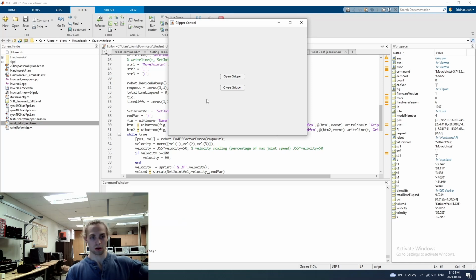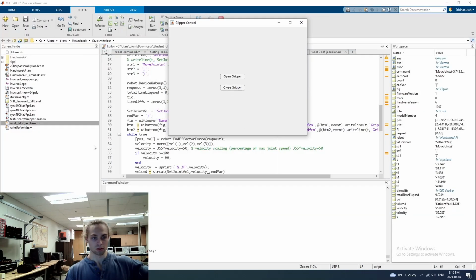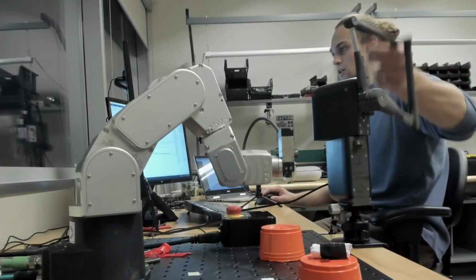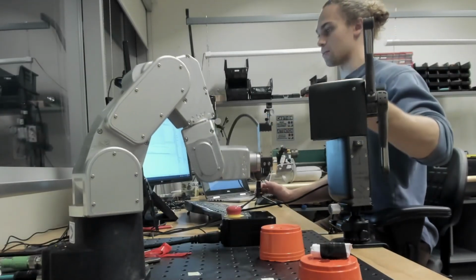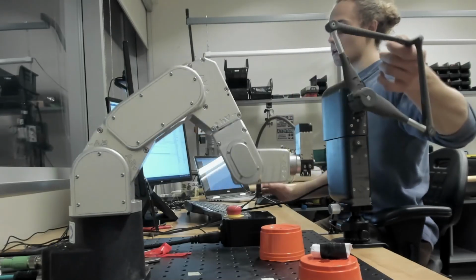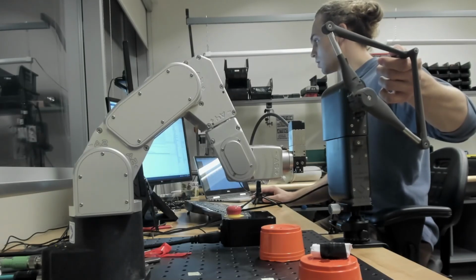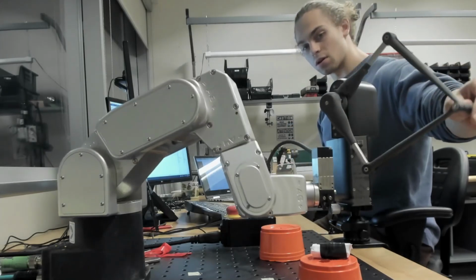So this is what you guys will see. It's got a gripper open and a gripper close. And you'll be able to control the robot like that. So this is me using teleoperation, and now it's using joint commands rather than Mechademic built-in commands. Well, it's using the move joints command, but I can pick up the object over there, so I'll click on the GUI and I'll open the gripper. I think it's already open. And then I'll pick this guy up.